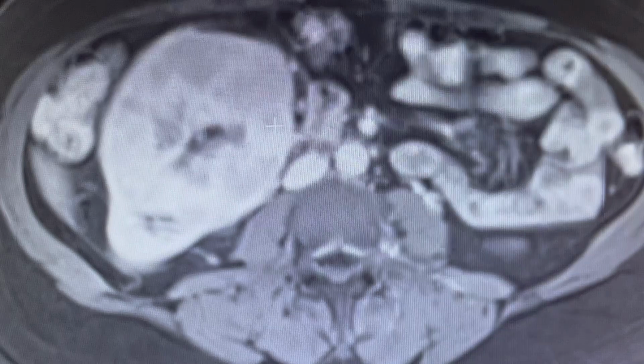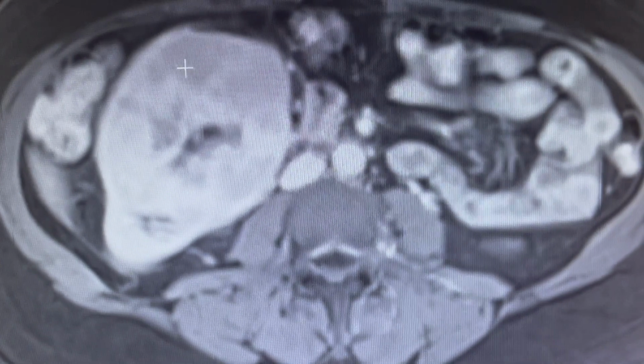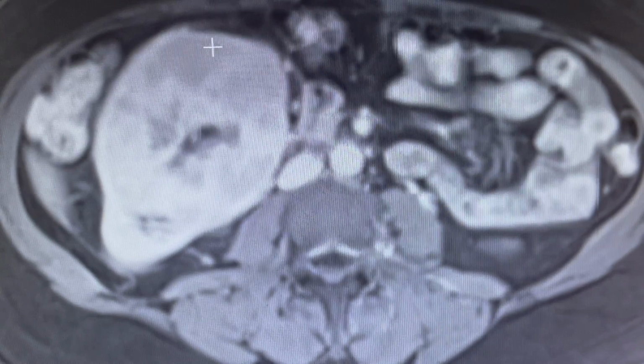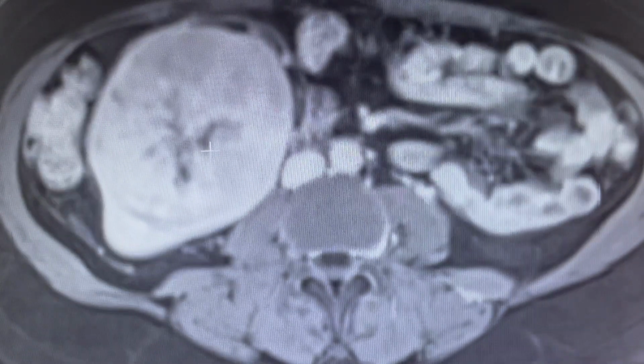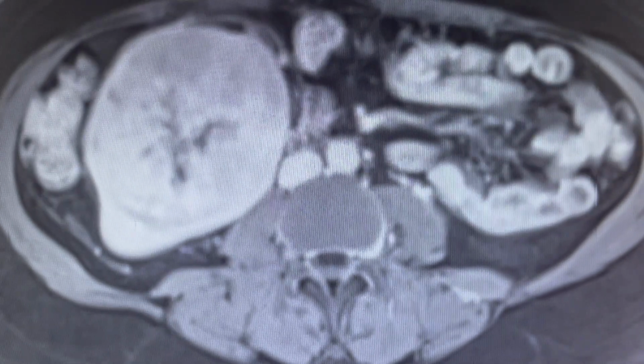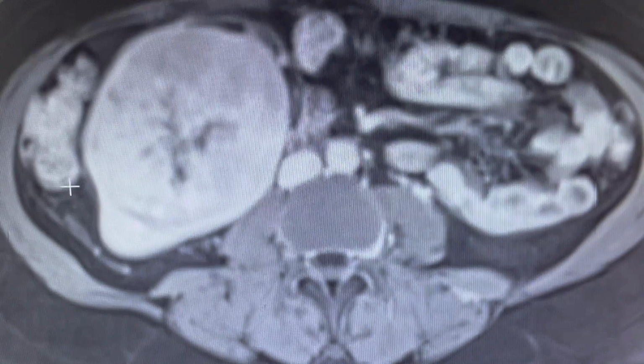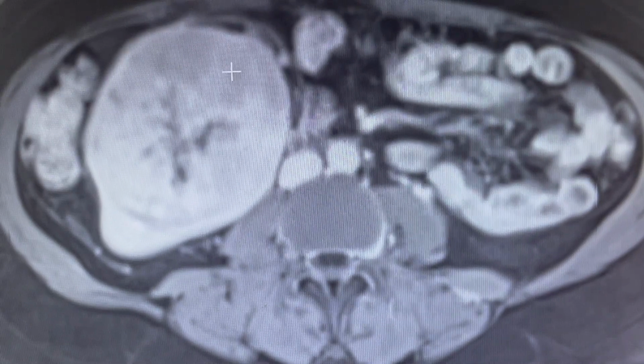And notice that the renal tumor, which had enhanced quite intensely earlier, now a lot of it is dark. I would call it washing out. But centrally, we see lack of enhancement. And again, we can see renal cortex and a beak sign because the masses are rising from the kidney.